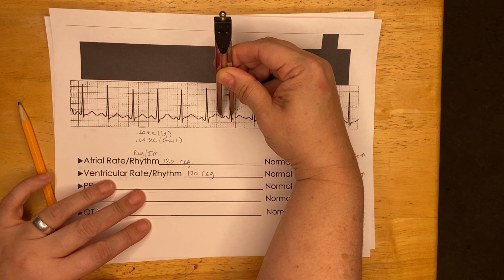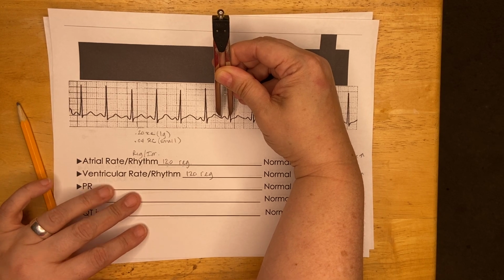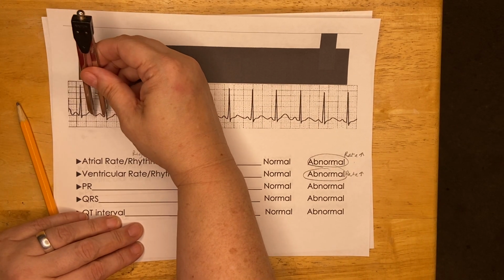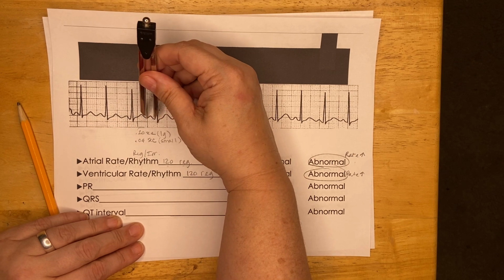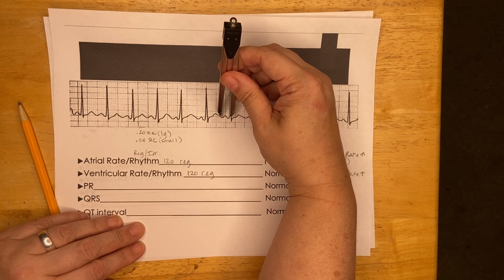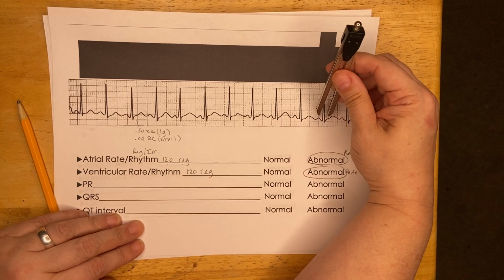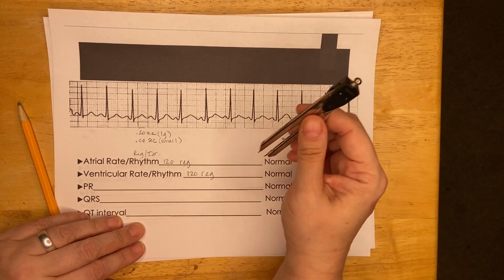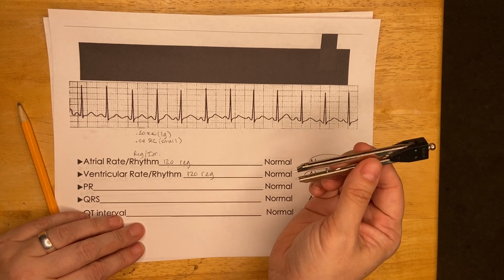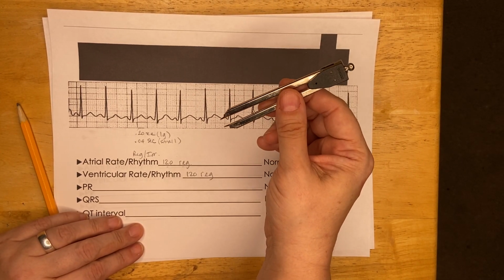And there's a couple of things I want to know about this PR interval. Number one, is it consistent all the way across the strip? And then secondly, I want to know how long did it take. So I'm going to measure, and I am just kind of putting my calipers on that R wave and seeing, does it look about the same from beginning of the P to the beginning of the R all the way across this strip? And it does to me. It looks regular. Now my task is to figure out how wide it is. So I find it easier to figure out the width either with the calipers or my paper, and I'll show you that on the next strip.